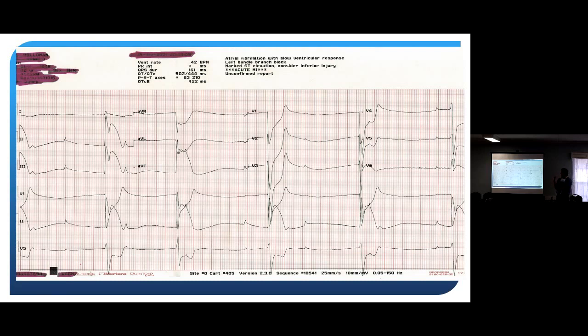And the other thing I want y'all to be aware of is that just because the EKG is normal, people can still have something really bad happen in a few minutes. So the dude went from a normal EKG, not feeling good, to I'm dying. Why'd you get a 12 lead? You should be pushing drugs and take care of me. Horrible EKG. Just looking at this, what do you think this is? It's too slow.